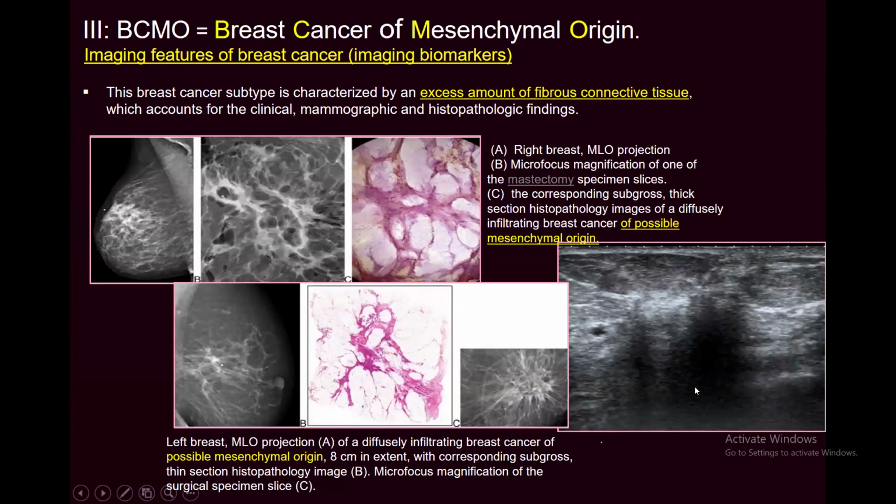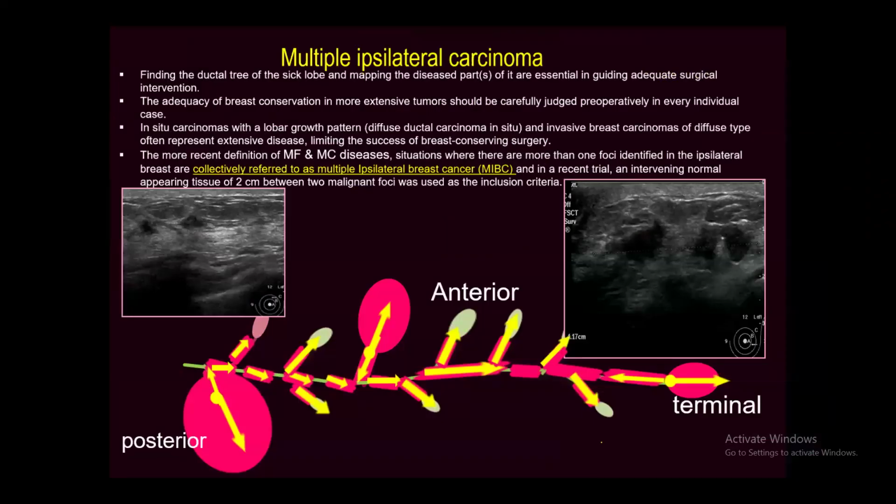Again, here you can see it. I cannot comment on histopathology; I will leave it for you, Dr. Nadia. But you can see here the excessive amount of fibrotic effect. Here also, look at the fibrosis and the corresponding ultrasound, with excessive posterior shadowing in the parenchyma, a diffuse area of non-mass-like lesions with posterior shadowing, reflecting the underlying fibrosis which absorbs the sound. Okay.